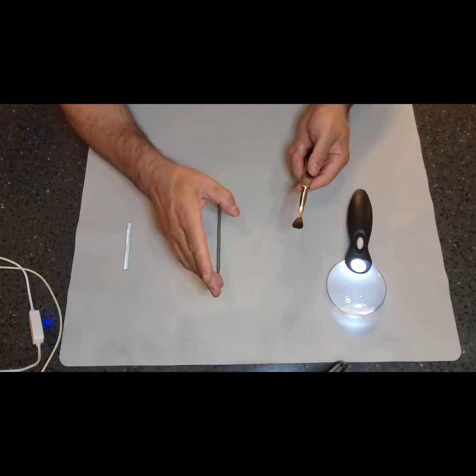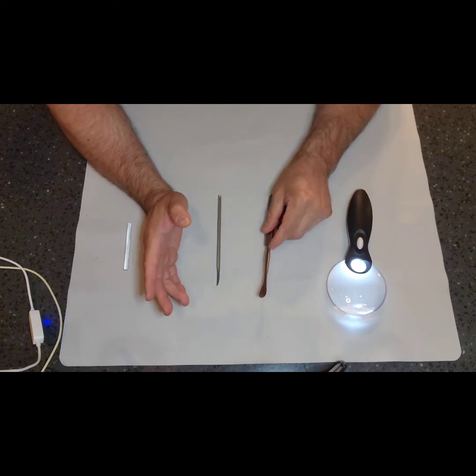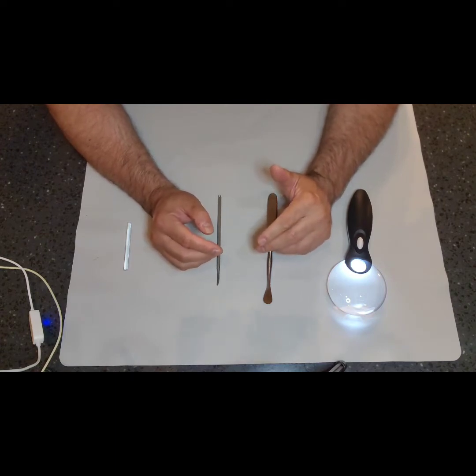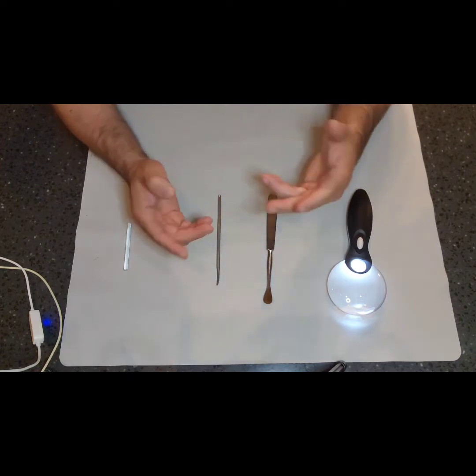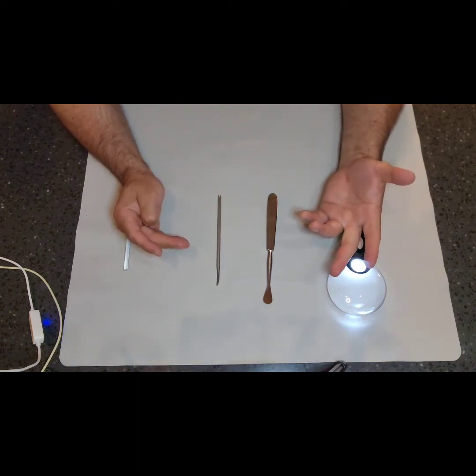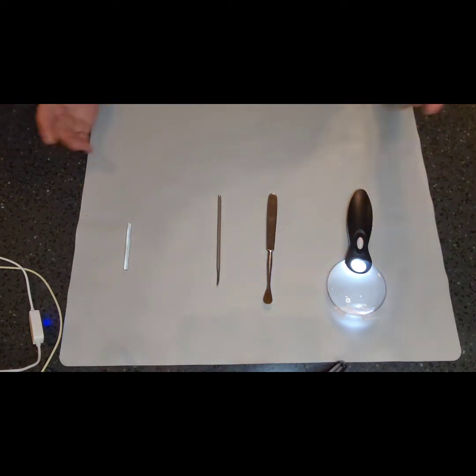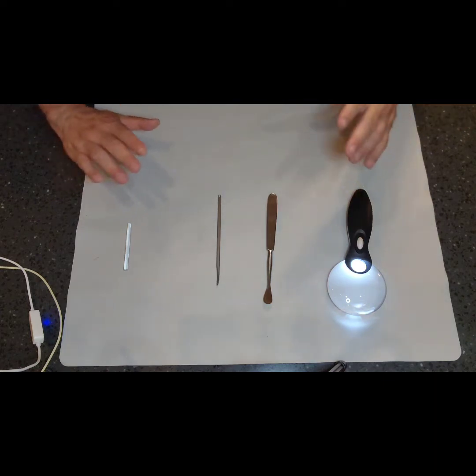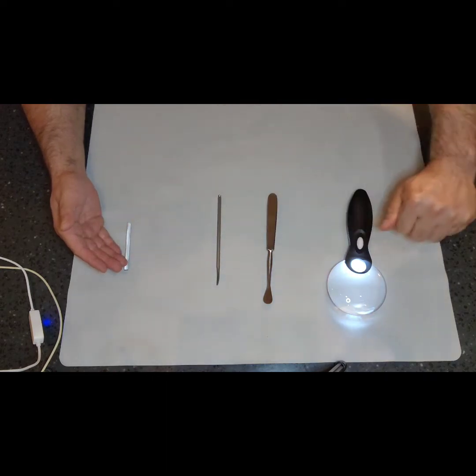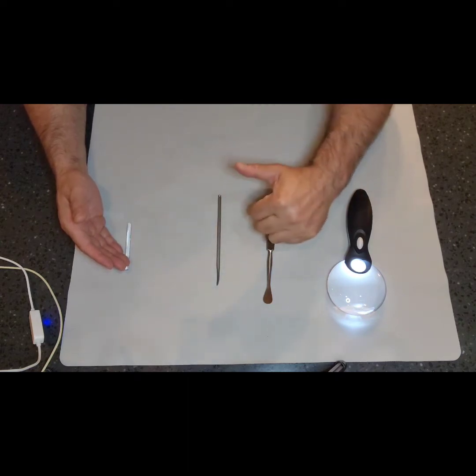And then stay there. For a dissector, think about the periosteal elevator. What is the periosteal? The periosteal is the actual layer surrounding the bone. What does that look like to you? If you've never been in surgery, I didn't even know bones had skin on it or a layer, right? Well, think about a barbecue video. That rack of ribs, when you turn it over to the bone side, when they tell you to peel back the silver skin, that's the periosteal that you're pulling off. It's a very tough layer that surrounds the bone.